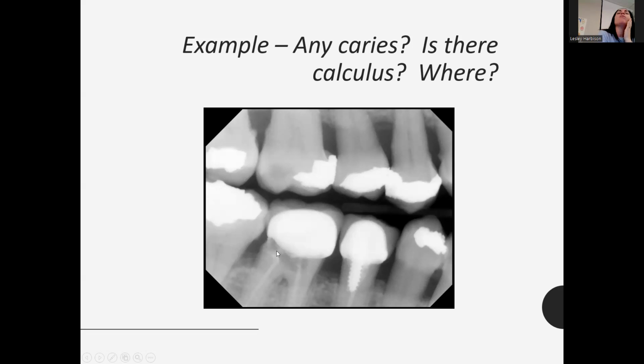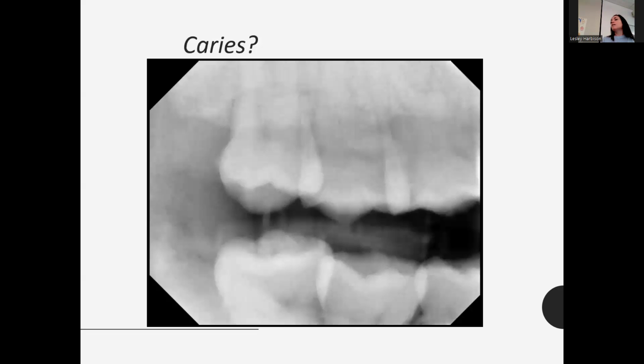You know how teeth that have had root canals can be sort of prone to root resorption, internal and external, and then sometimes it happens and they do the root canal to try and stop it and it doesn't stop it. That almost is what it looks like to me, but it could just be recurrent decay as well. Who knows? There's a lot of stuff there.